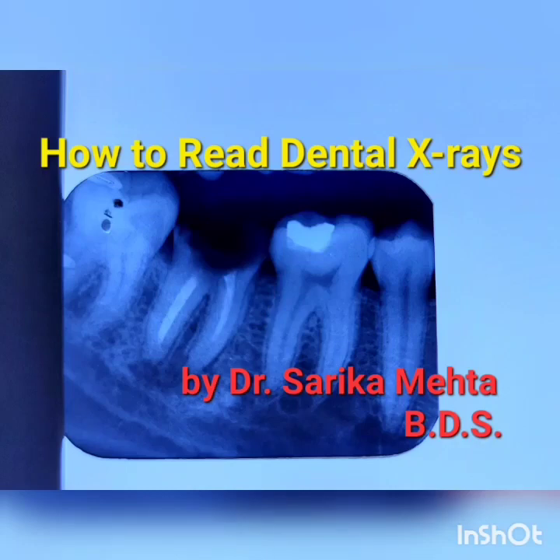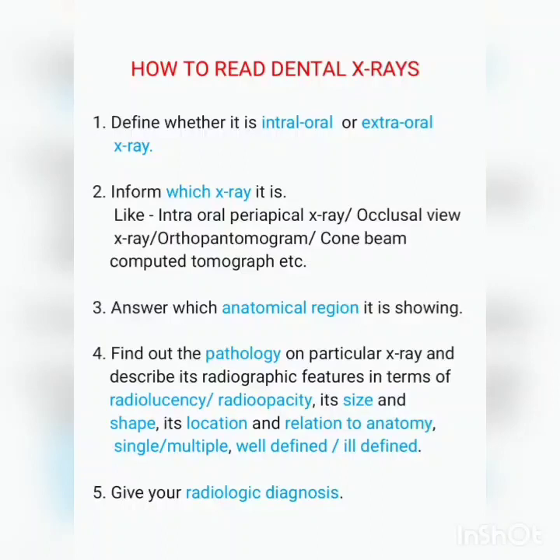How to read dental x-rays. This learning will be of great help to dental students for their exams and to dental surgeons for better communication with colleagues. First, define whether it is an intraoral x-ray or extraoral x-ray.